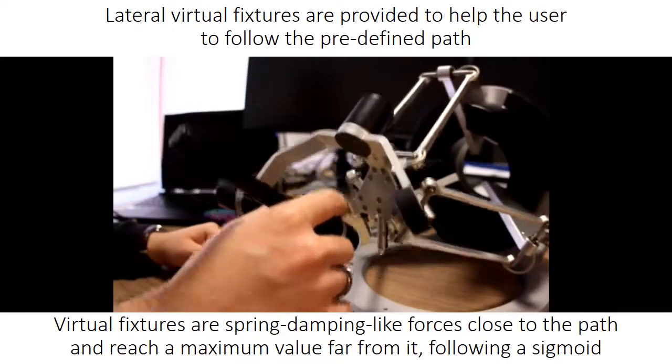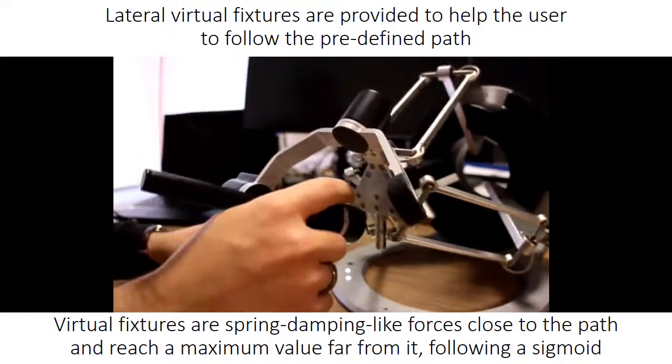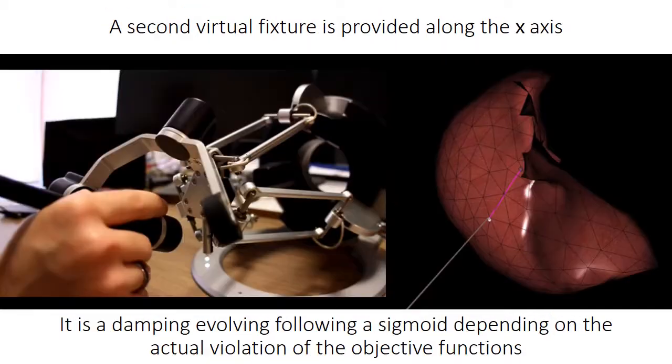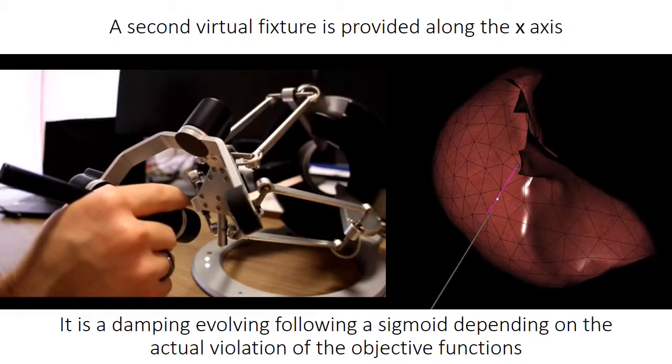Lateral virtual fixtures are provided to help the user to follow a predefined path. Virtual fixtures are spring-damping-like forces close to the path and reach a maximum value far from it following a sigmoid. A second virtual fixture is provided along the X-axis. It is a damping evolving following a sigmoid depending on the actual violation of the objective functions.